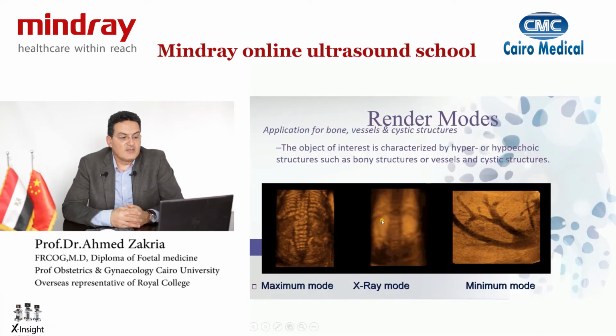Not only that, we then developed a different approach, which is how can you look into the different structures and use the utility of the 3D volume of group of data together. So for instance, when we wanted to look at the bones, we can choose different rendering modes according to whether we are using imaging for bones or vessels or cystic structures. So we can use the maximum mode for seeing bones, and in that mode, as you can see here all the vertebrae, you can count them, you can see the processes, you can count the ribs. You can use a minimum mode where you mainly focus on soft tissue structures and mainly blood vessels. You can see a minimum mode image of the liver where you can see the division of the portal vessels across the liver.